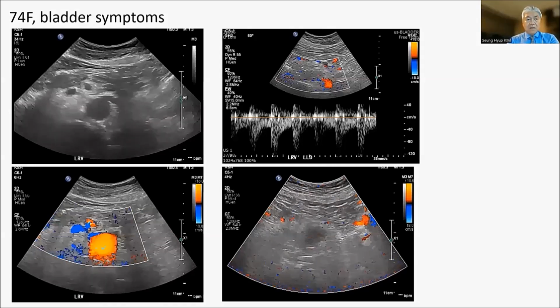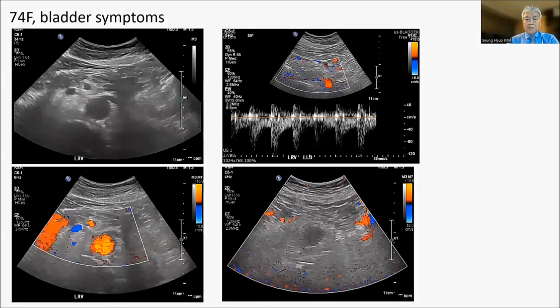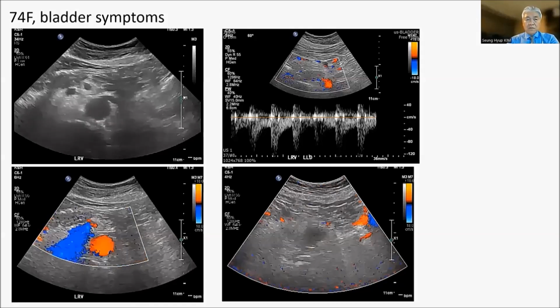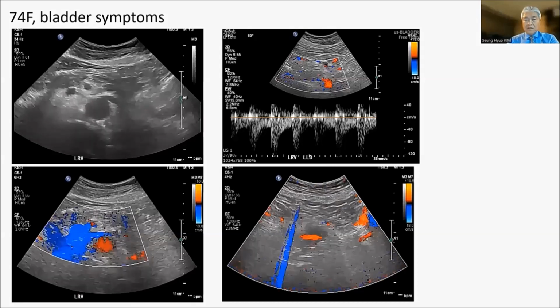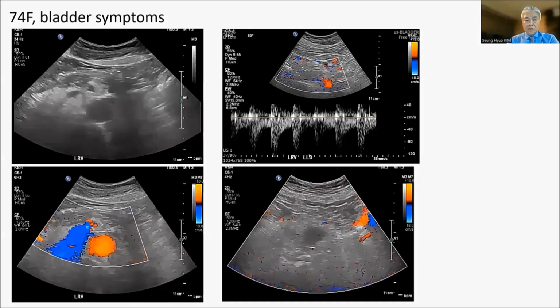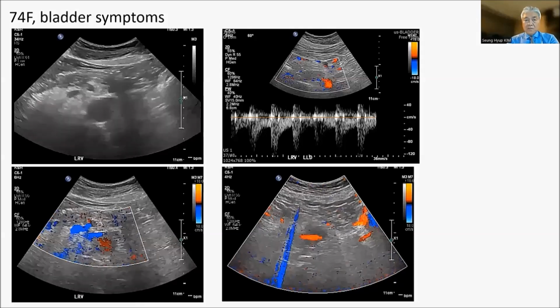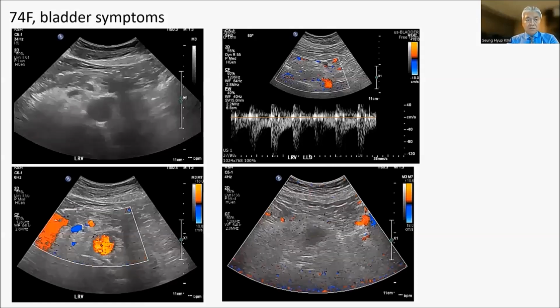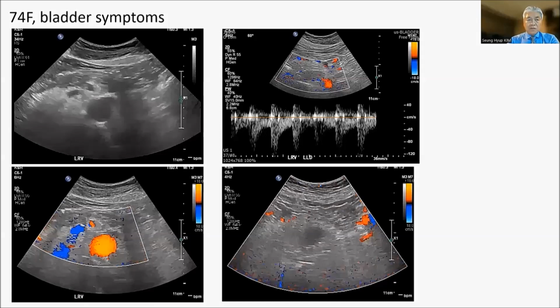The Nutcracker phenomenon like this condition is called compensated Nutcracker, and these patients are usually female with prominent regurgitation into the gonadal veins and severe pelvic congestion. In this situation, left renal vein pressure is not high, and the patient usually does not have hematuria, proteinuria, or left flank pain, but has symptoms related to pelvic congestion.